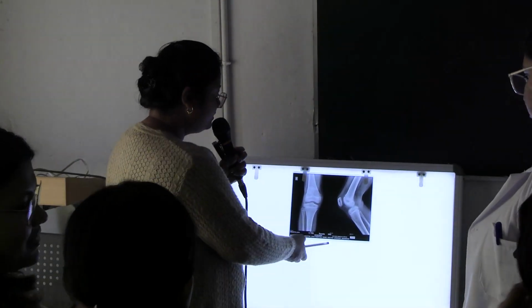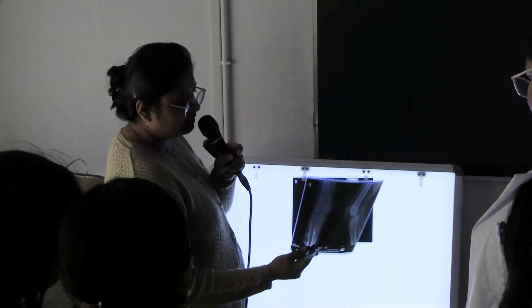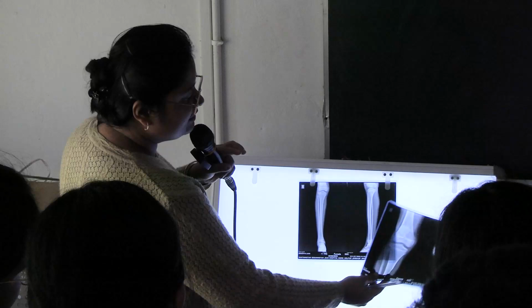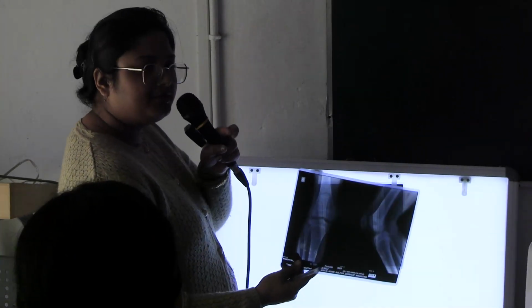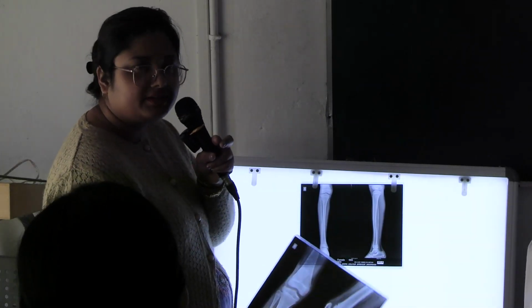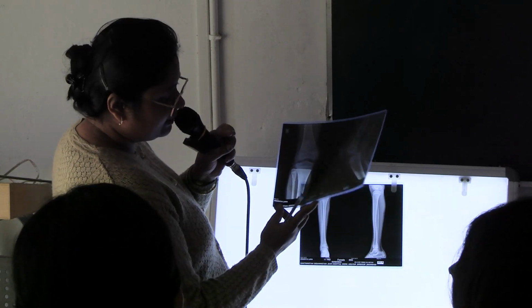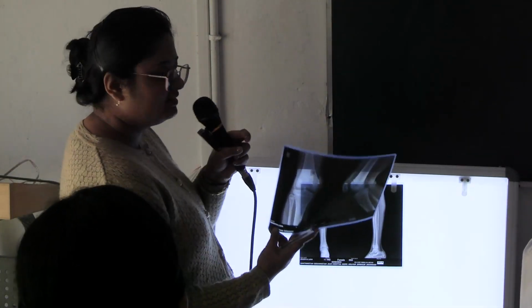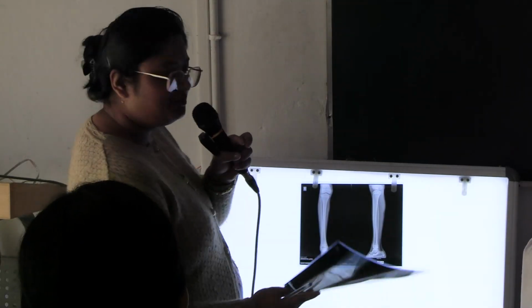Okay, that's all. This X-ray is done. Okay, and also you have to tell the side. Side is written here. This is right side. Here also this is of right side. And you can also mention the name of the patient, age of the patient, and sex of the patient. Okay, this is X-ray of Aradhya Laha, 11 years female patient of this joint containing all these, you can write, but main points you must write.